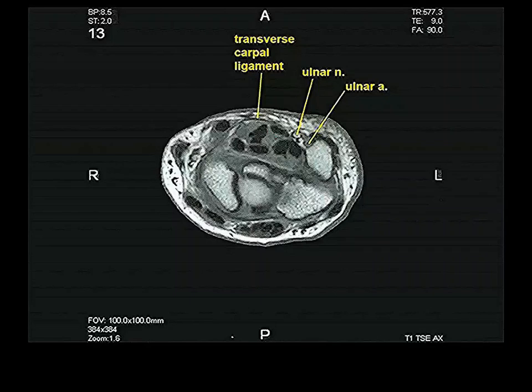This is stuff outside the carpal tunnel, ulnar nerve and ulnar artery. Take a look at this again. Tell me something that's wrong about it. It violates my rule because I labeled it wrong. Not on purpose, but by stupidity. The nerve is always posteromedial to the artery. So this is really the ulnar nerve, and that is really the ulnar artery. So this is labeled incorrectly.